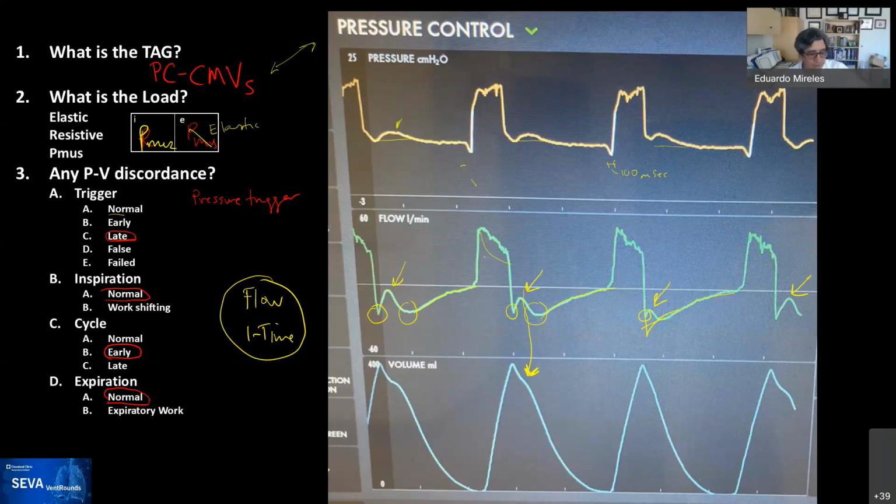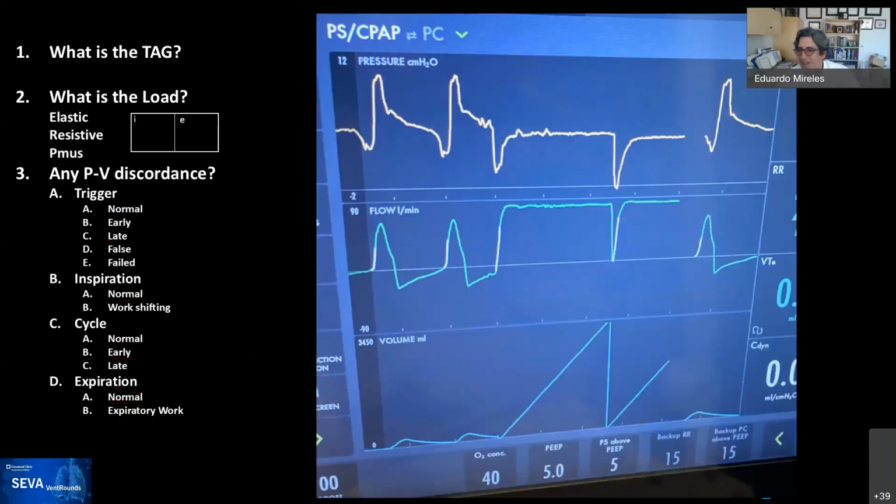All right, we have 15 minutes left. I'm gonna do this one just because it's very sexy. I was walking through the unit today, and I was taking my usual pictures, and this happened. So I would ask anybody that wants to read it to go at it, of the fellows first. Anybody wants to go at it? Any of the fellows, have no fear. Sherry is here.